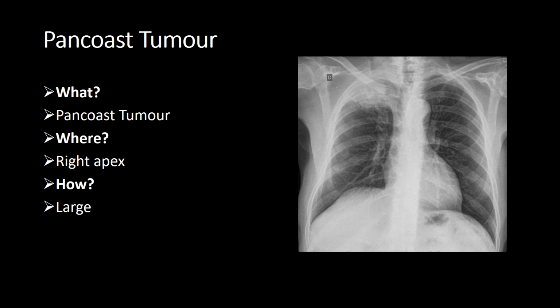Unfortunately, some tumours will hide, and the lung apices and hiding behind the clavicles is an absolutely classic location. Equally, the overlap of the first and the second ribs can cause some confusion.